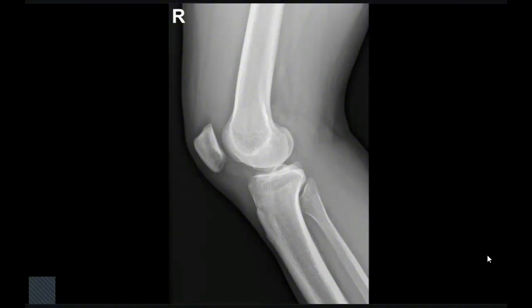Okay, go ahead. I will give you the history. Trauma, knee trauma. This is a simple case, but a common exam case. This is a lateral radiograph of the knee for a trauma patient. First thing I can see is a suprapatellar effusion.